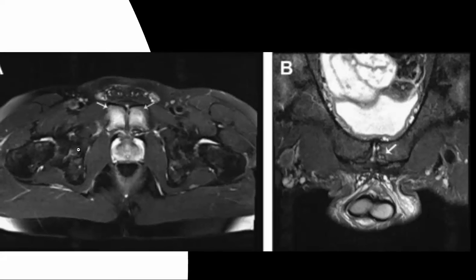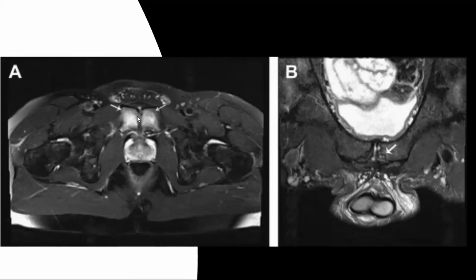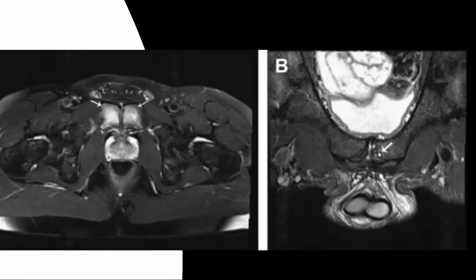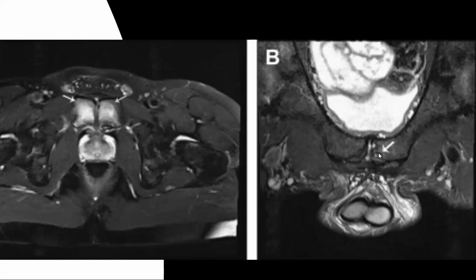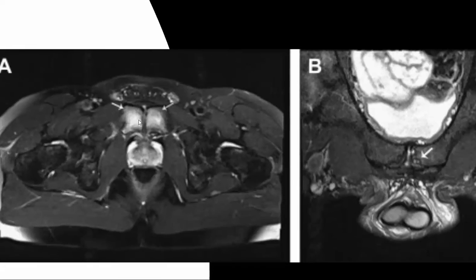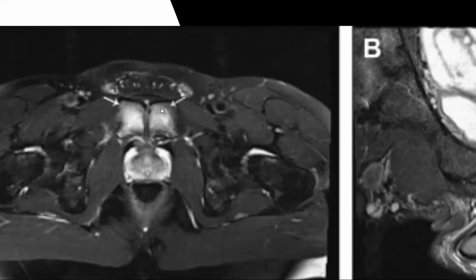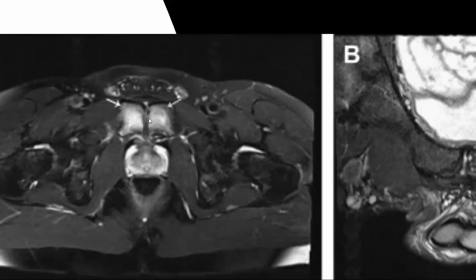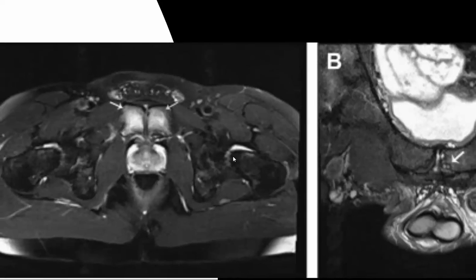Now let's orientate ourselves, see if we can work this out. This is an axial image through the pelvis. This is your symphysis pubis, your left and right parasymphyseal bone, and this is the coronal, of another patient, but similar pathology, left and right parasymphyseal bones, bladder over here. Fluid sensitive sequence, so your eyes are drawn to the bone here. There's lots of marrow edema left and right side. This is parasymphyseal edema. There's a little bit of fluid within the symphysis pubis.